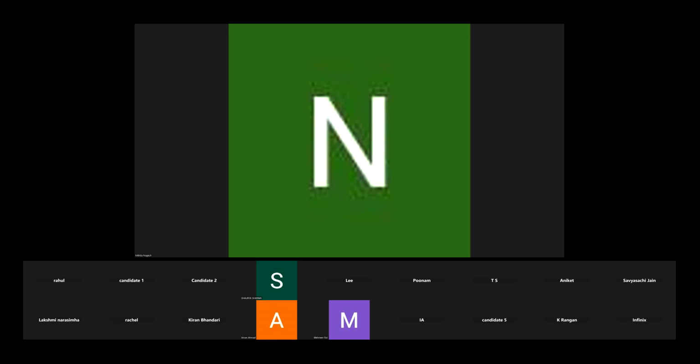DISH can have ossification along the sacroiliac joints but it does not have fusion, and ankylosing spondylitis will have bilateral sacroiliitis with erosions along with fusion in chronic cases. Also, DISH is more common along the right anterolateral aspect of the thoracic spine because it is limited on the left by the pulsation of the aorta. We don't see it that much on the left side.